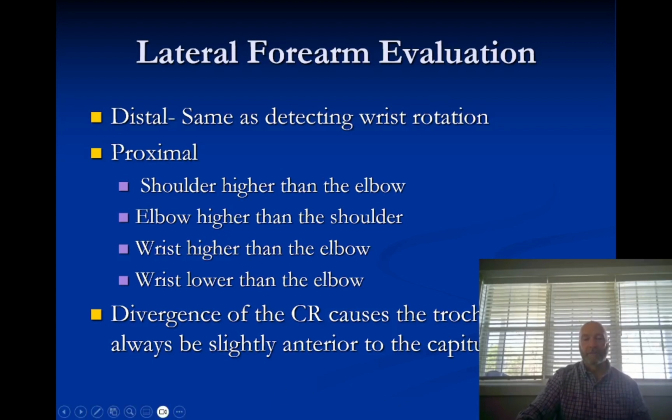The two condyles that I'm talking about are what we refer to as the trochlea and the capitulum. If you still struggle with which one is which, I usually use this to straighten them out. Word association is a big thing. If you pop the hood on your car, let's say your car overheats because you've lost some coolant and it's starting to steam out from underneath the hood. If you pop your hood, what should be way up front, unless you're working on an air-cooled engine like an old Volkswagen Beetle, what you should see right up front, very first thing, is what we refer to as the radiator.